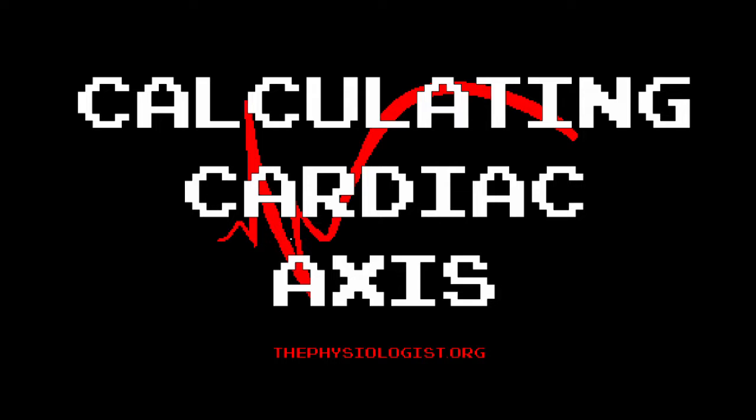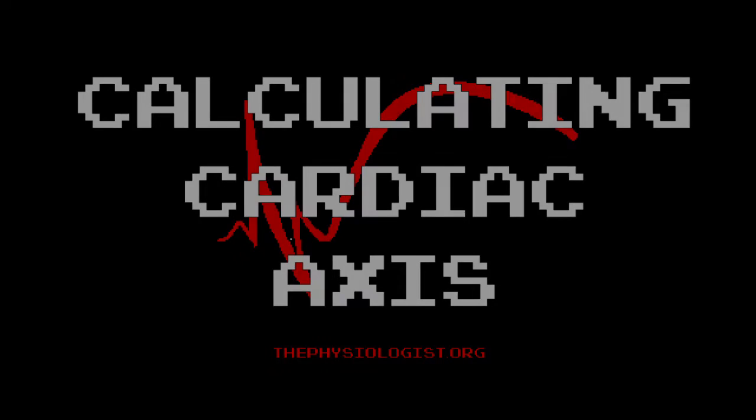And by the end of this video, you should know exactly what you have to do to calculate a cardiac axis, and you'll be able to go off and practice on your own, and before you know it, you won't even need the hexaxial reference system diagram because it will be stored in your head. Okay, so let's calculate the cardiac axis.